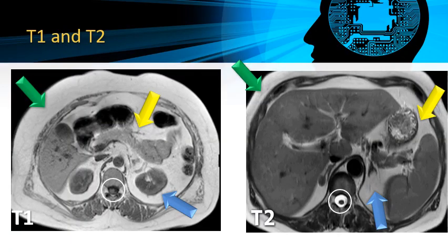So here is another example, and if we apply our approach for recognition between T1 and T2, we can notice that the white circle refers to the low signal intensity of CSF spaces on T1, while it is bright on T2. So we have T1 on the left of the image and T2 on the right. Also, we can notice different arrows.